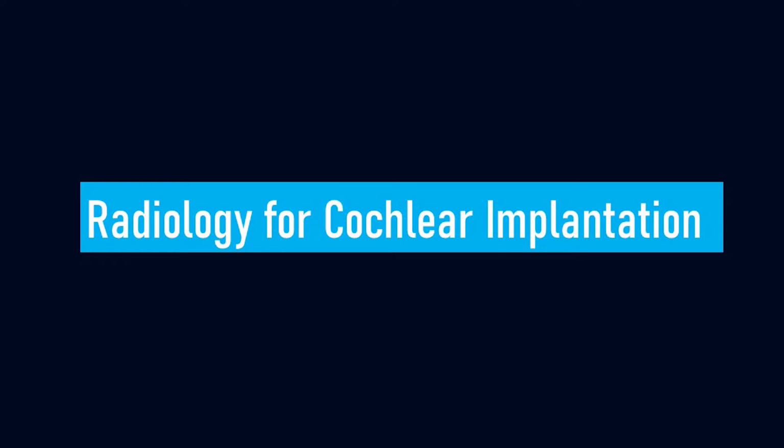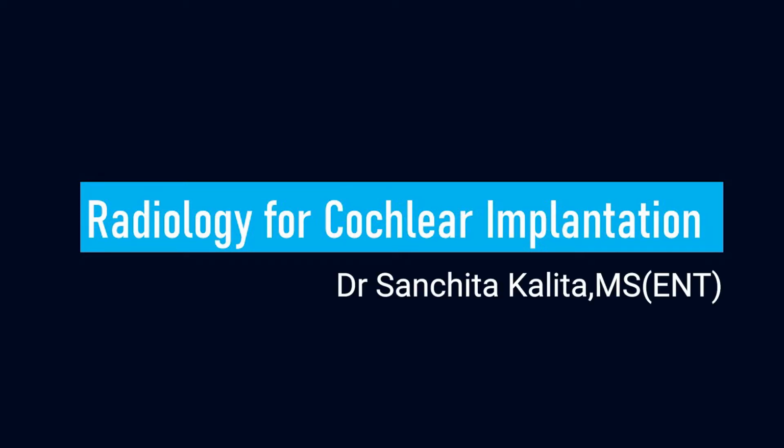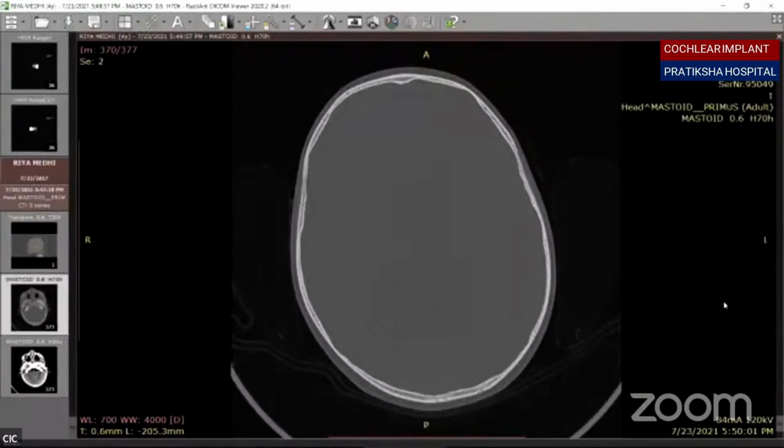I will quickly walk you through the radiology part. We all know that radiological evaluation is very important for the candidacy criteria as well as for the surgical feasibility. Let me just bring the DICOM software into the screen view. Yeah, it's coming. I hope the DICOM view is visible.